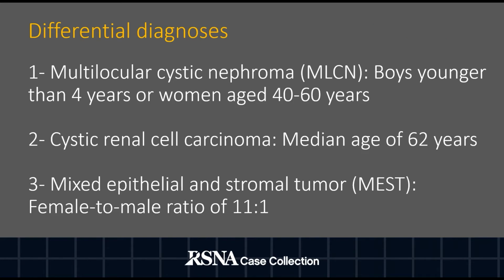Generation of a differential diagnosis is guided by first classifying the cystic lesion according to the most recent 2019 Bosniak classification. Our lesion can be bucketed into the Bosniak 3 classification, which is defined as one or more enhancing thick, greater or equal 4 mm width septa. Some typical Bosniak 3 lesions are listed below.